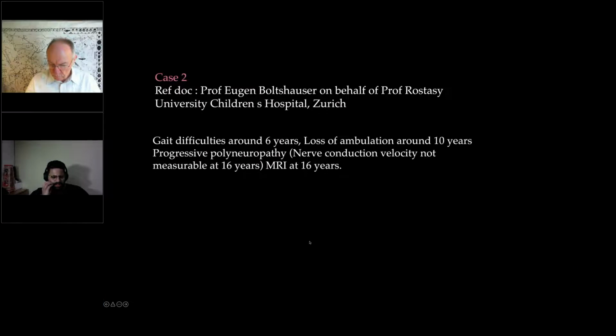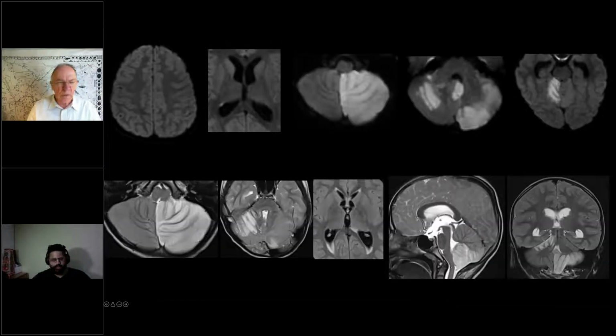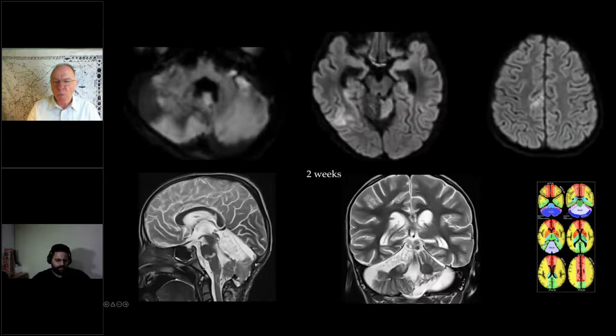And then the clinical question was, Dr. Lokesh, if this is arteriopathy or if this is possibly a moyamoya. Is that the question? One of the post-decompression, any abnormalities that we can look at this point in the acute period. Okay. I think we had a CT done as well for this child initially. Yeah, the CT showed mild, I didn't put it up, but it had mild basilar impression. But that has been relieved or at least improved on the post-operative scan.